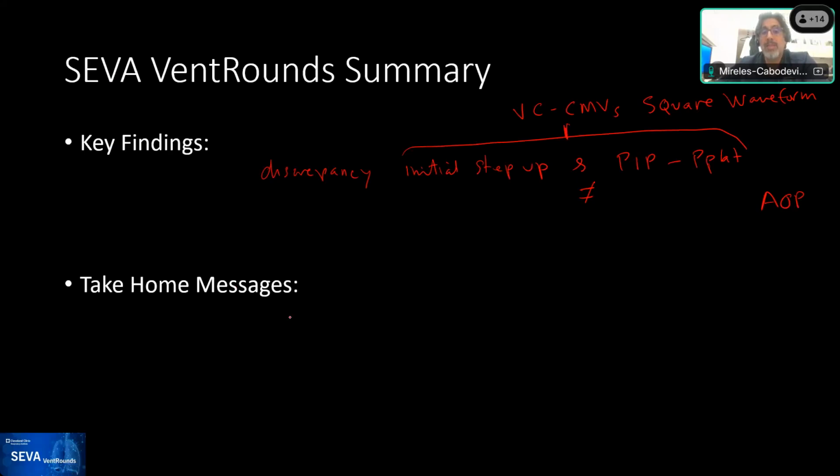And so the take-home message here is regarding the driving pressure. Remember that your driving pressure in the presence of airway opening pressure or auto PEEP can lead to inappropriate measurements. So remember, always use the total PEEP, and always look for airway opening pressure, especially in patients with severe asthma or severe obesity. Those are patients that may have an airway opening pressure.